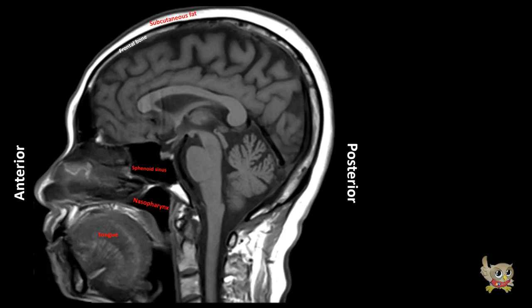The frontal bone is demonstrated in this cut. The clivus is a bony part of the cranium at the skull base. It is the sloping midline surface of the skull base anterior to the foramen magnum and posterior to the dorsum sellae. Now, one of the important landmarks that divides supratentorial from infratentorial structure is the tentorium cerebelli.